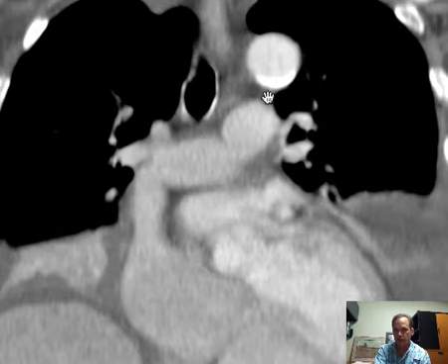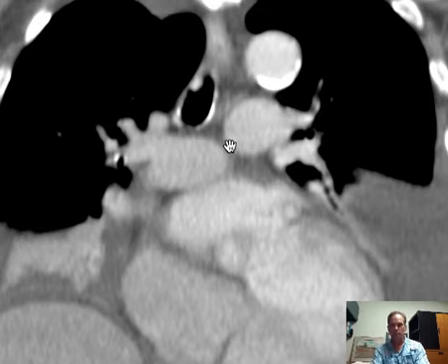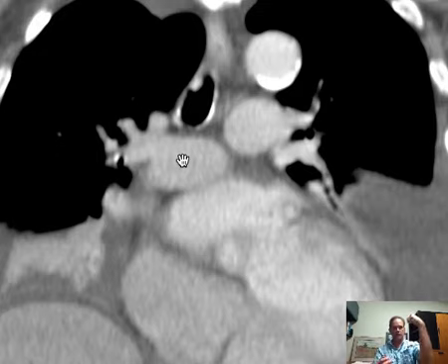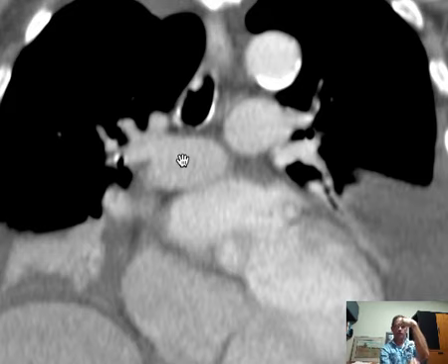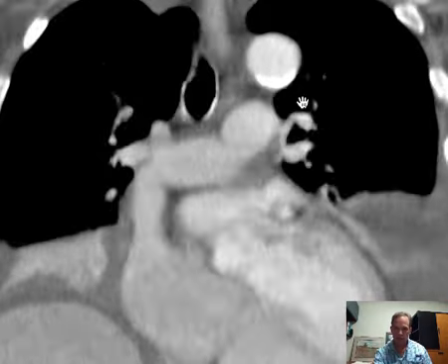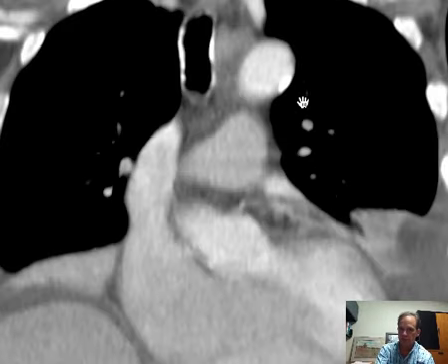So follow the aorta back, aortic arch, and you look under the aortic arch, you have the branching, kind of Y branch of the main pulmonary artery, forming the left main pulmonary artery and the right main pulmonary artery. So if this is the aorta coming up and over like that, this is not going to be a very good demonstration, the main pulmonary artery comes back and then divides like that, in both directions, right and left, under the aortic arch. So just remember that, and I think you'll be safe in analyzing which is which.